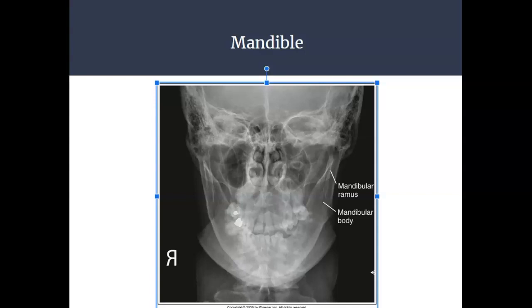Image analysis guidelines for the mandible AP-PA projection state that distances from the mandibular rami to the lateral cervical vertebrae on both sides should be demonstrated as equal, and the width of the mandibular rami should be demonstrated symmetrical. The mandibular condylar processes are visualized through the mastoid processes, and the mandibular rami should be seen without foreshortening.